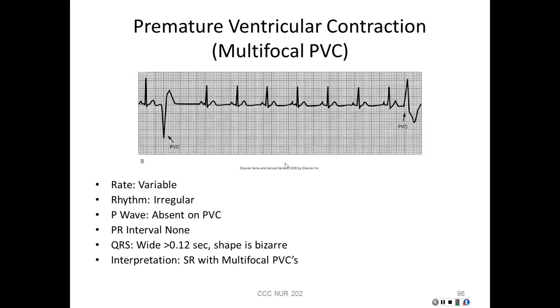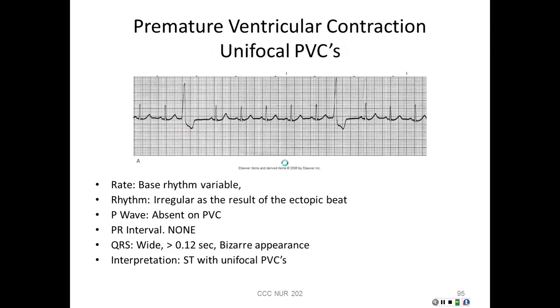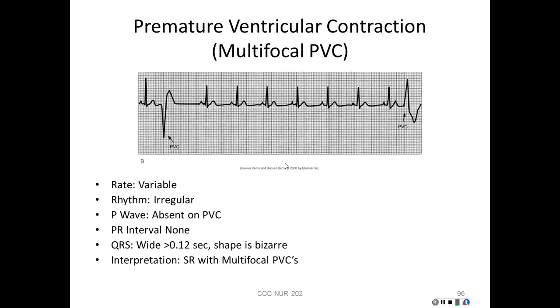what they look like. Now, what we had before are unifocal PVCs. What we have here is called multifocal PVCs. One thing about a PVC, the QRS complex, whether it's going down or whether it's going up, is always in the opposite direction of the T wave.